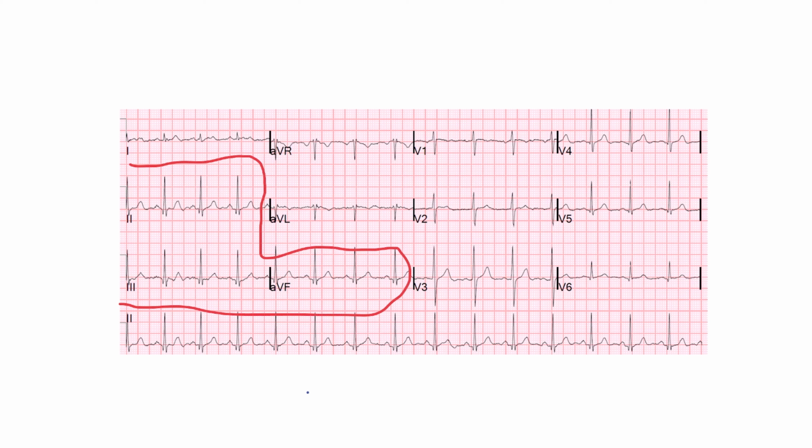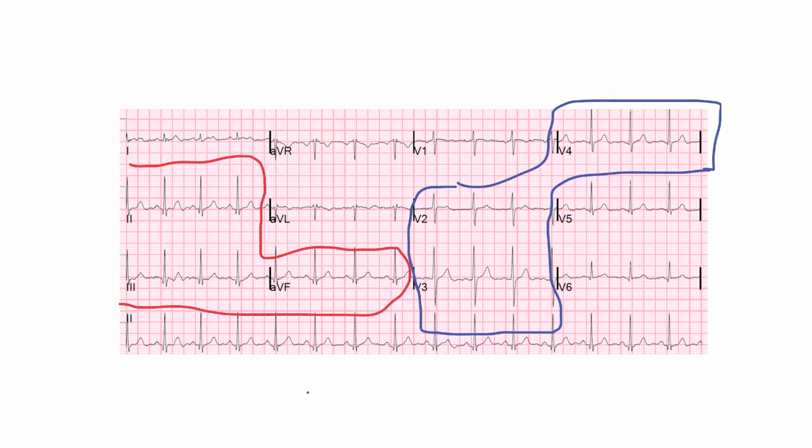and when we're changing the color to blue, we will then note out another very easy area, which is the anterior part. So anterior, so let's say it's V2, V3 and V4, like that. So that represents the anterior part of the heart. Then we have the lateral. So for the lateral, we'll pick another color, so we'll go green. And if we just block off V4, V5 and V6, that's our lateral leads here.